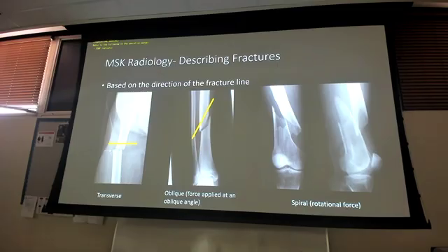You can do the same thing with the shoulder if you have the thorax, because you can look at it and go, where is the rest of the body supposed to be? But if I have just an elbow, I don't have any other part of the body to do a relationship with it. It's just an elbow. I have no thorax. The key part of this is thorax. Do I have thorax in part of the x-ray to tell me what's left or right based off of my anatomy? Yes.